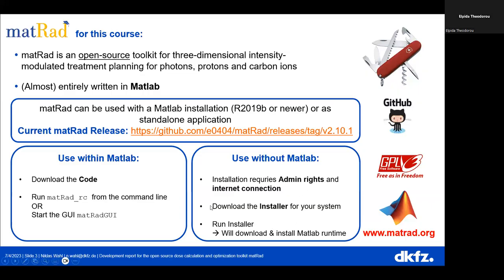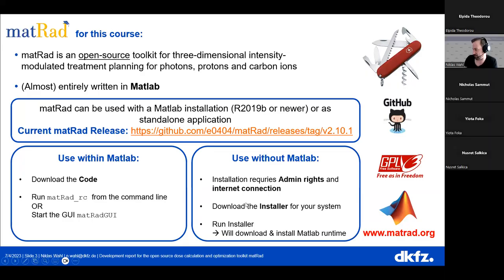But in principle, you download the installer for your system and run it, and this will also download and install a MATLAB runtime. So do not worry when it says it needs to download some stuff. It needs to do that to run in the background. That's just what's needed for running any MATLAB program as a standalone application. So that's the two ways to do it. That's what we need to run the software.